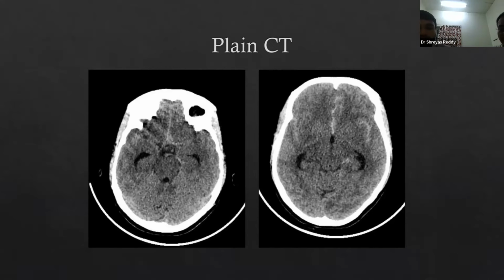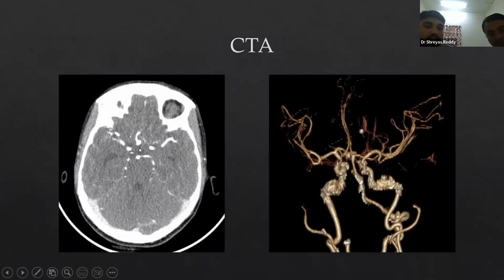Fine. Now you know where exactly you're looking. Can you go into the CT angio image? These images are not of great quality. Even then, can you interpret what you see here? So here you are seeing a saccular outpouching arising in the area of the ACOM that is better delineated here on the 3D reconstructed image. Yeah. So this is an ACOM aneurysm.